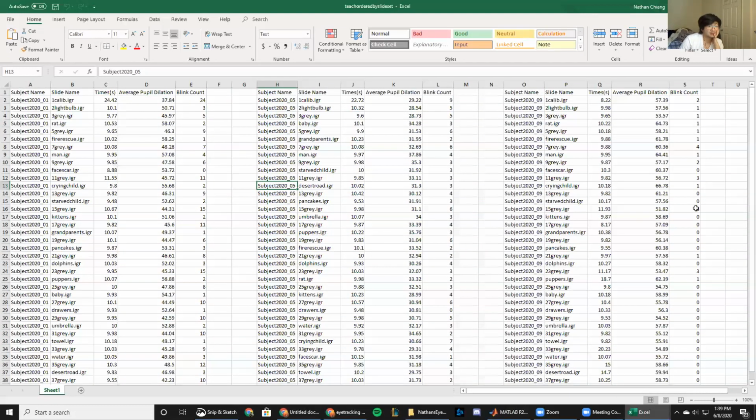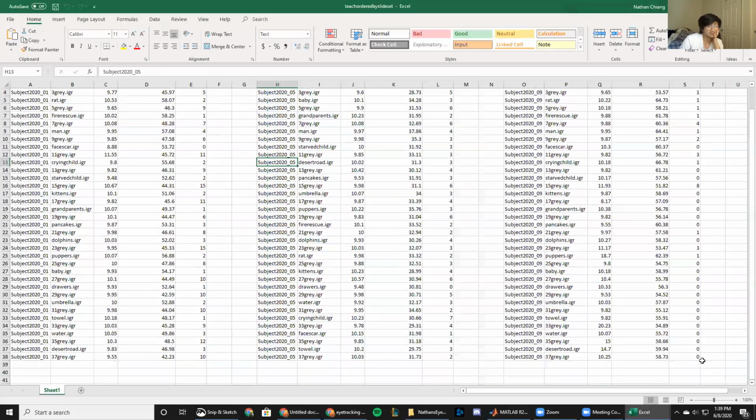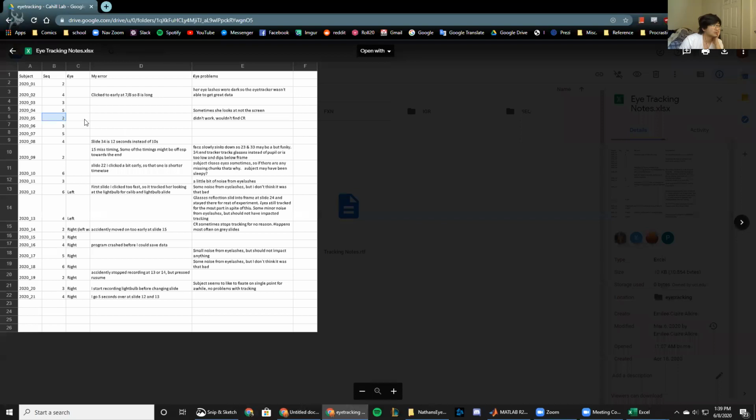So this might be useful because if you're trying to find weird trends, like here, look at this. This is all zeros. Maybe we can figure out why. This is subject 9? Some slides, face slowly sinks down. So 23 and 33 might be a bit funky.